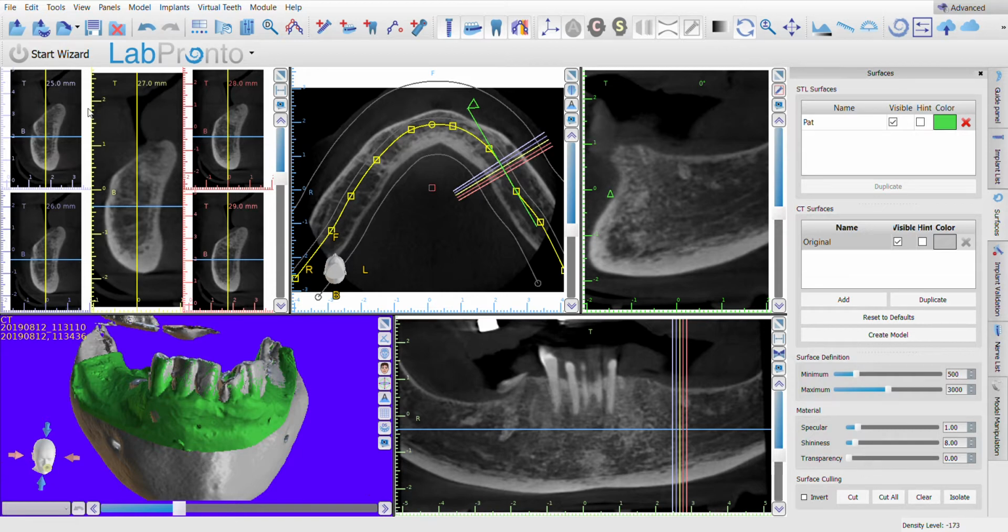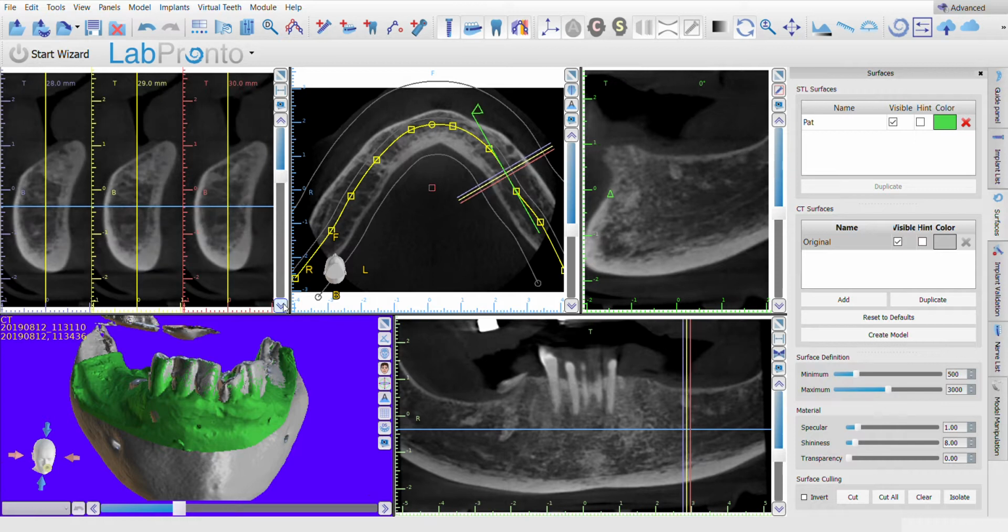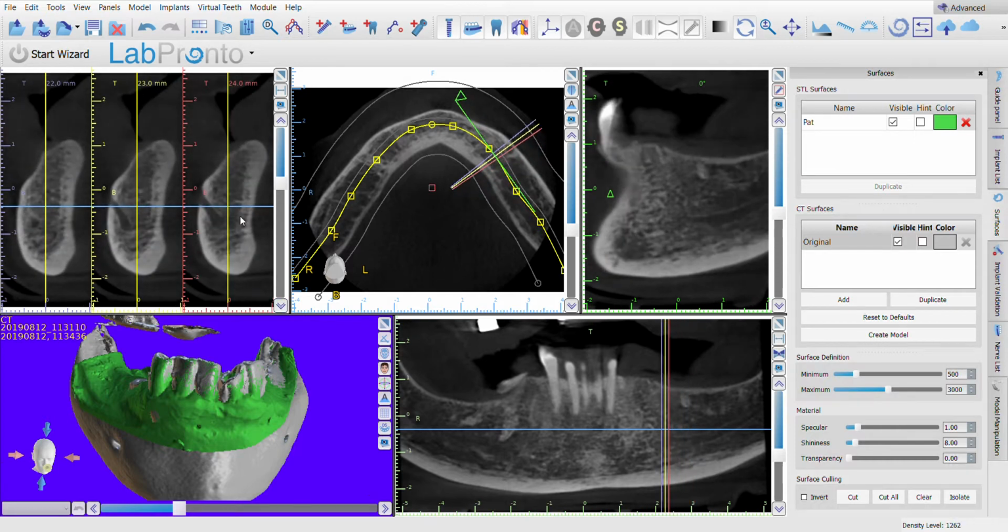But just to give you an understanding, take a look over here and see what just happened. I changed this to a 5 viewing image of cross section, and all of a sudden we have 5 lines in this area corresponding to this. Okay, so I like to go ahead and go back to my 3 because I can see each one, and then you could always scroll down between the images if you need to take a look at it, but I think the 3 is good enough.